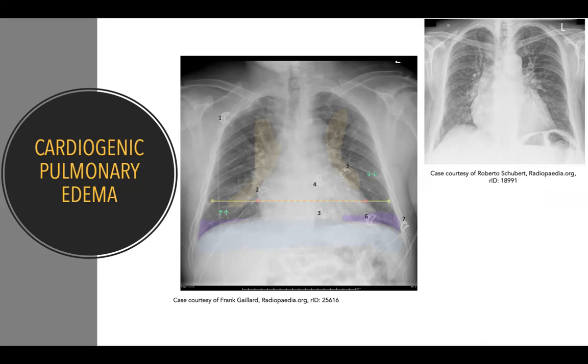This isn't the true diaphragm. Instead, it's a fluid collection in the pleural space indicating bilateral subpulmonic pleural effusions. This pathology is only apparent in the upright position due to the gravitational shift. Also note the distance between the gastric bubble and the pseudodiaphragm. This is a common feature that aids in identifying left-sided subpulmonic effusions. The top right chest X-ray serves as a reference for normal distance between the diaphragm edge and the gastric bubble.